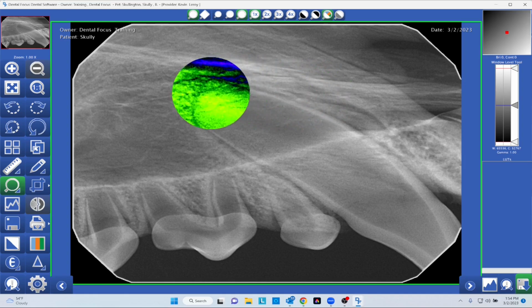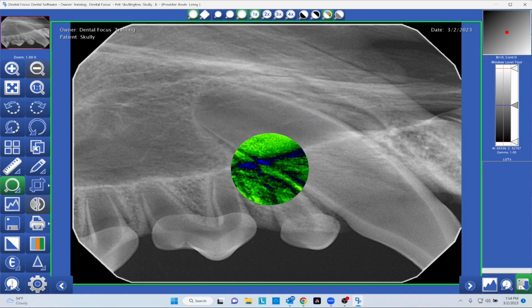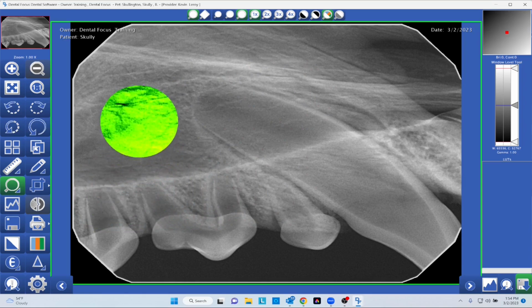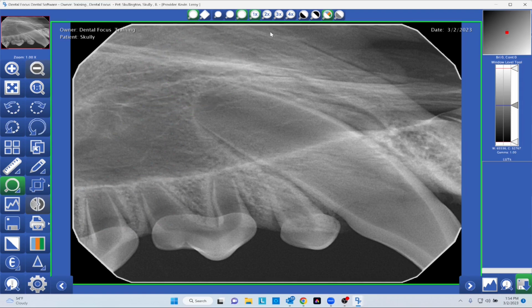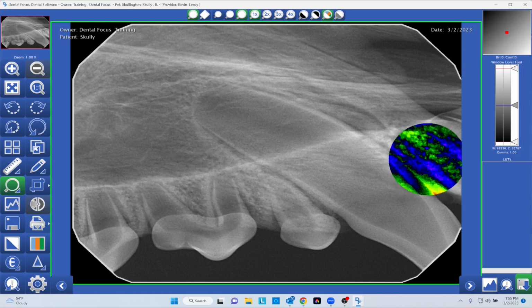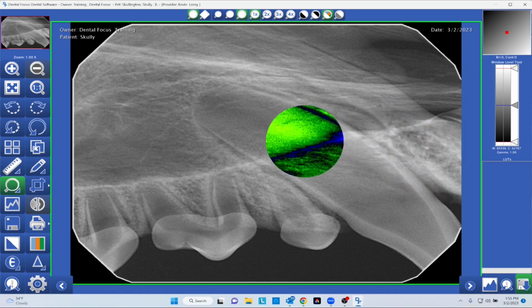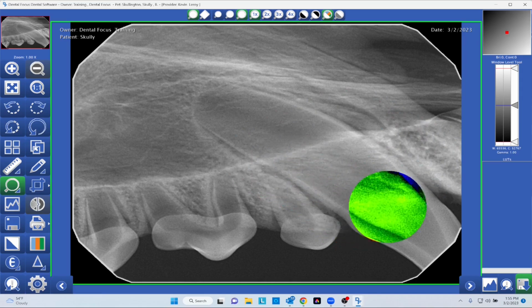Colorization. Now with colorization, we can see about 50 shades of gray. With colors, we can see about 60-something thousand, I do believe. So in this case, when we do have a particular area of interest that could be changing subtly, we will be able to see those color patterns change easier than we can the black and white.